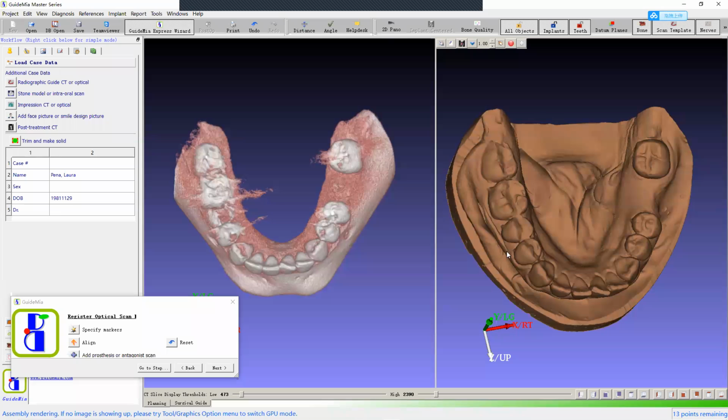In that case, we need to make a radiographic guide for the patient. The guide would not be like a denture, but more like aligners or a retainer that covers all the teeth. So that's a little about scanning protocols. For such a case, to align the model with CT, we need at least 4 natural teeth. Ideally surrounding the implant site.